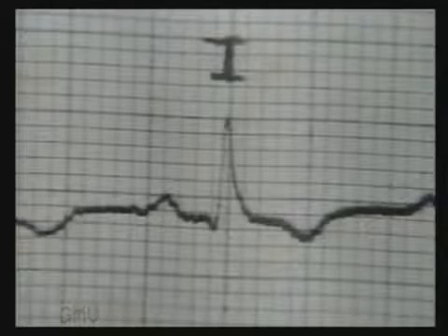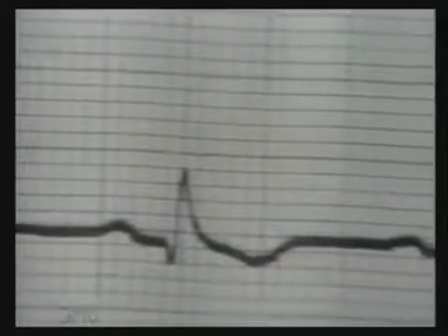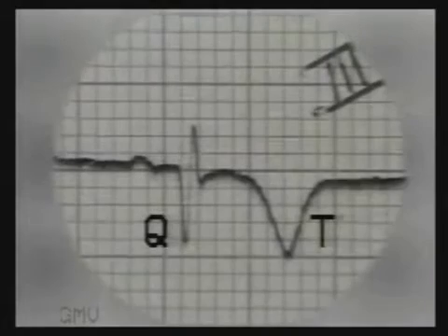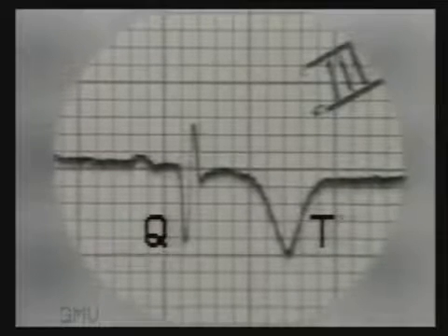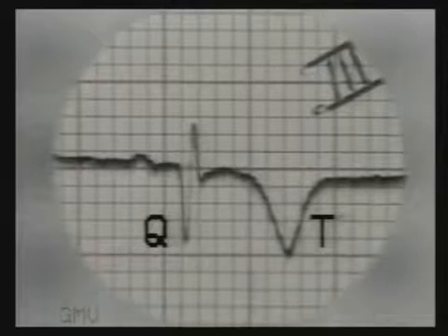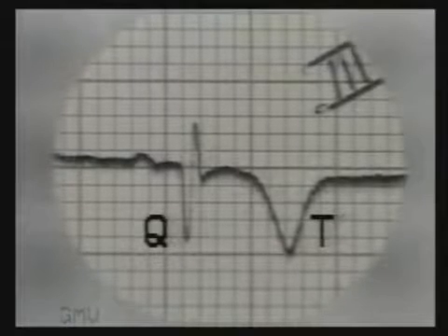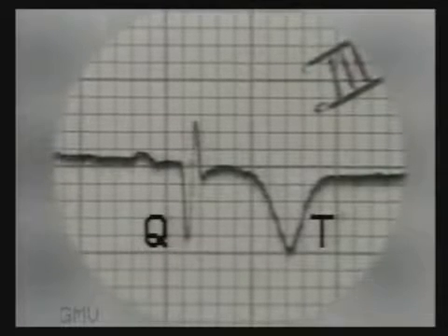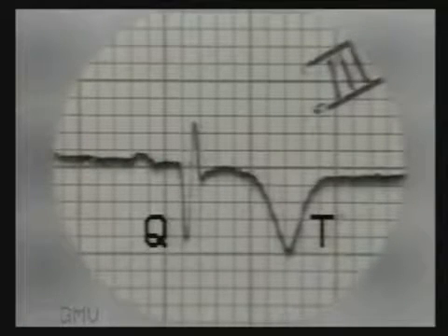Now see another tracing, no Q wave in inspiration marked I, and note the appearance of Q wave during expiration. Lead 3 of this ECG shows deep Q wave, isoelectric ST segment and deeply inverted symmetrical arrowhead-like T wave of inferior wall myocardial infarction. This picture is seen between 3 weeks to 3 months. If ST segment elevation persists after 6 months, it suggests a development of ventricular aneurysm.